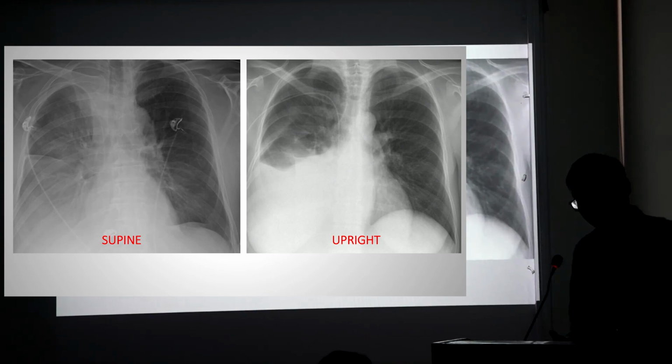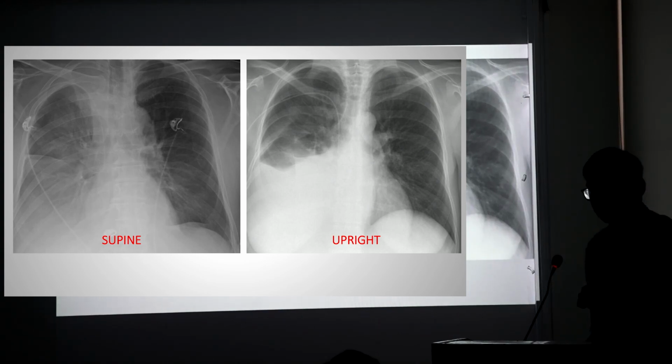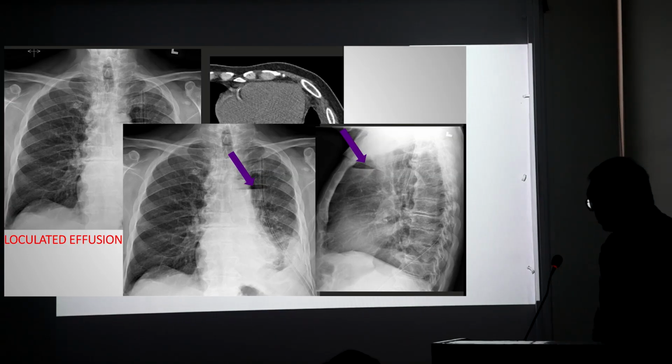So always try to do the X-ray in sitting position. You have to give instruction to the technician that please do this patient's X-ray in sitting. Otherwise, we'll be thinking about other pathologies.